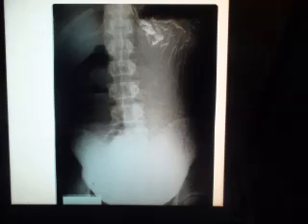Another barium meal with a hugely dilated stomach reaching down to, you can see here the iliac crest, and here the femur and the hip joint. You can see the stomach is hugely dilated, reaching down to the pelvis with a soap dish appearance and failure of the dye to pass into the duodenum, which is called gastric outlet obstruction or cicatrized duodenal ulcer.